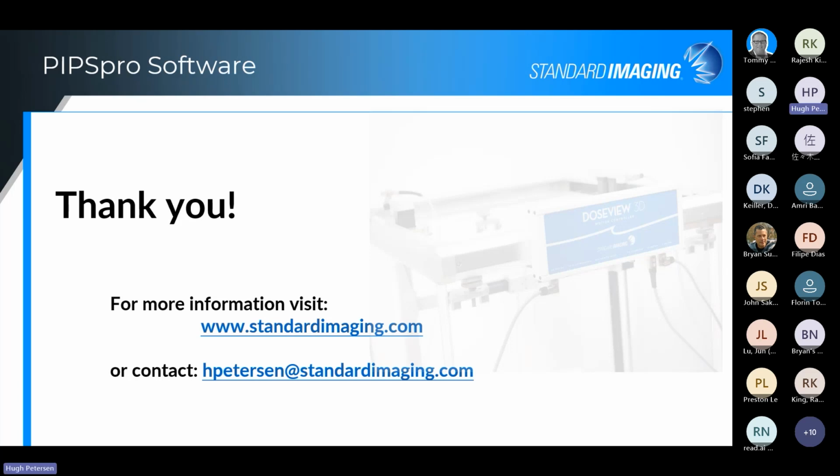And then, do the above 2 questions about the raw images and the pitch value affect the image quality? If so, do these factors get included in the CT sim process? Again, using the same daily protocol, you use the imaging, and that should maintain the quality and consistency for the best results over time.